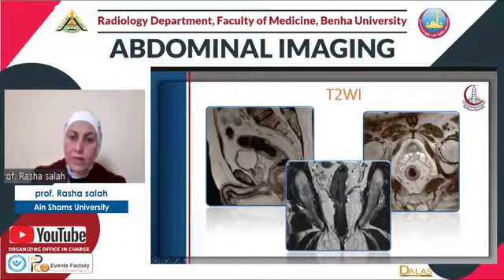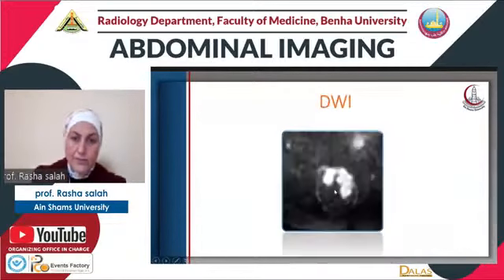And when we perform the coronal images parallel to the anal canal, we can nicely see the anal sphincter complex and also the rectal lesion, if present, at the lower rectum. Diffusion weighted image allows identification of the tumor as a very hyper-intense signal on the diffusion weighted image, denoting its restriction, and this is an indirect sign of high cellularity of this tumor.